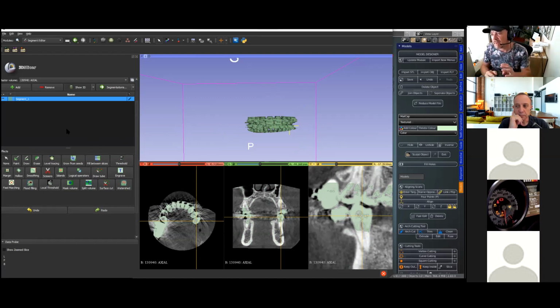Now, you guys may think we've got a Blender slicer link. And yes, we can link it, but the CT scan models are very dense, and dense models will clog up the system. So we're working on a refreshing procedure, and this is why we want to be able to export. So we're going to go to the segmentation. And by the way, we're recording this so you can look at this later.